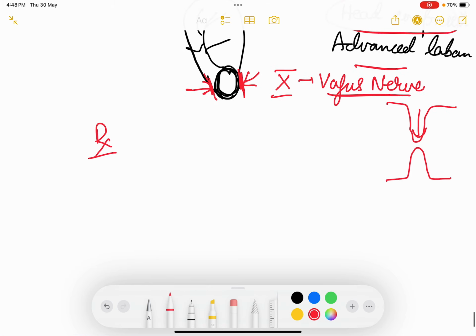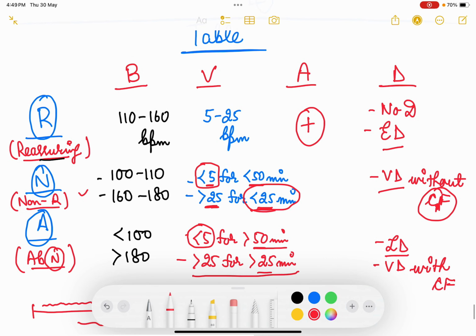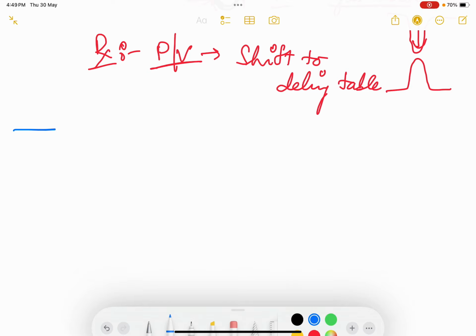So what is your management? What will you do? You do a PV examination and try to look for whether patient is fully dilated or not. If she is fully dilated, shift the patient to delivery table, and prepare for normal vaginal delivery. It is never pathological. That is why I have told early deceleration is reassuring. ये अच्छा है, ये साइन है कि पेशेंट अभी नॉर्मल लेबर से डिलीवर हो जाएगी, पेशेंट ऑलमोस्ट फुल्ली डायलेटेड है. सो इसमें कुछ घबराना नहीं होता है अर्ली डिसेलरेशन. नेक्स्ट कम्स वेरिएबल डिसेलरेशन.